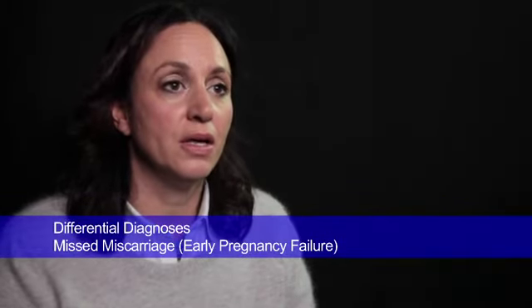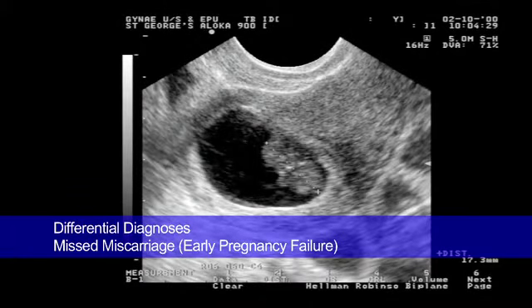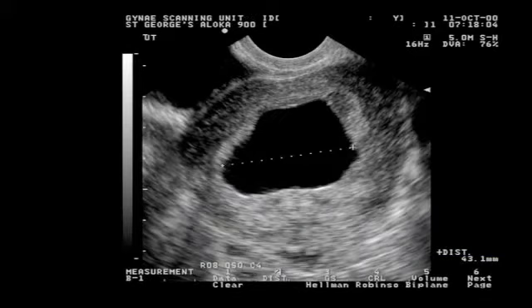We also have the term missed miscarriage. This is now frequently referred to as an early pregnancy failure. A missed miscarriage describes the scenario where an embryo dies, an early fetal demise. However, the pregnancy and its tissues and fluids and gestation sac are not expelled, they're retained within the uterine cavity. This is commonly diagnosed on ultrasound when a gestation sac is seen with or without a fetal pole within it, and the pregnancy is no longer ongoing.